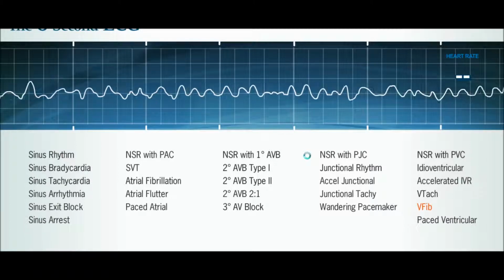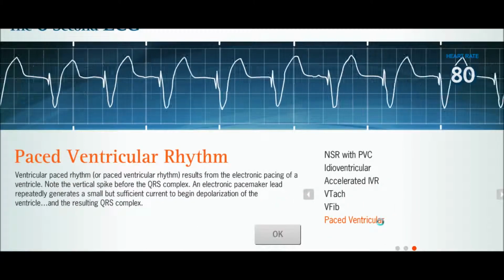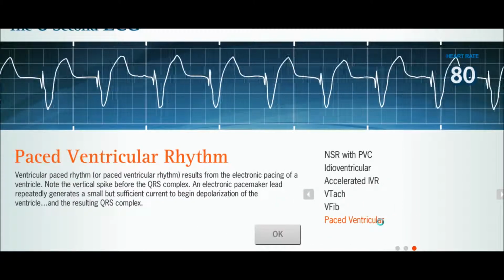As a bonus rhythm, I'll give you this one, and I want you to tell me whether or not you can get it. I'll let you look at it for a second. I'll pause it here for you.